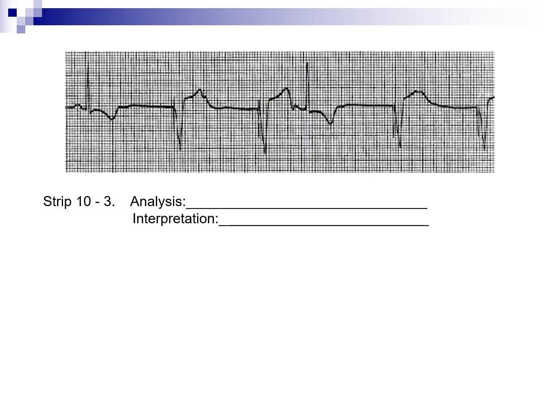Now we're going to be doing our pacemakers. So in 10-3, we are looking at this rhythm and this patient has a pacemaker with the patient's own beats also coming in. So the patient's own beats have a PQRST, but for the pacer rhythms, you can see that there is a pacer spike and there are QRSs that follow these pacer spikes. With that said, we know that it's capturing because every single pacer spike has a QRS.